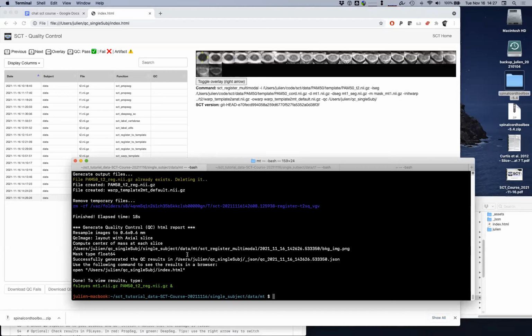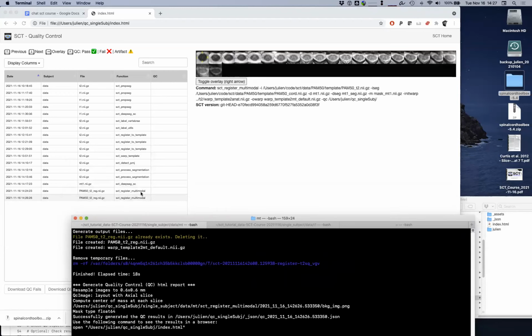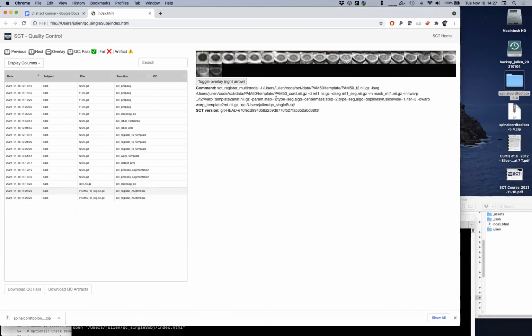We could use manual params, slightly different from the ones I used here. And I invite you to play with this, to basically use the image here. What would be the result if you use image seg, for example, IM seg?